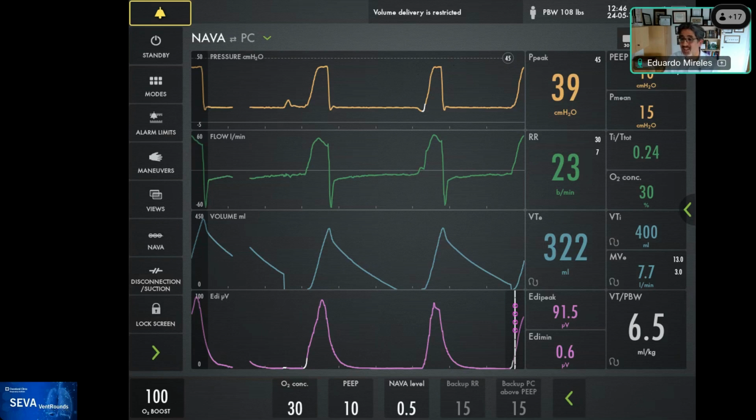So yeah, and that's why, Miguel, you see the plateau. The plateau is being caused by us so that the patient doesn't get more pressure after that. So it plateaus because it's pressure limited now. And so during that period of time until it cycles off, it's going to get to that maximum level. So that's why we see that. And absolutely, Ariel, you're correct.